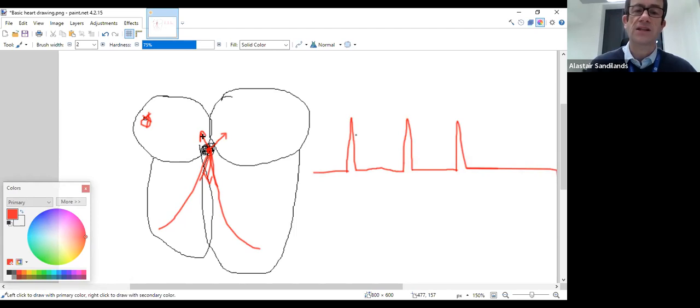And so going back to the atrium, there may be some P waves. So the firing of the P wave might be evident, it might not. The P wave going back to the atrium could be there. It could be at the end of the QRS, or it could be buried in the T wave. There's three areas. So now we put those together and see what you can see on an ECG with junctional rhythms.